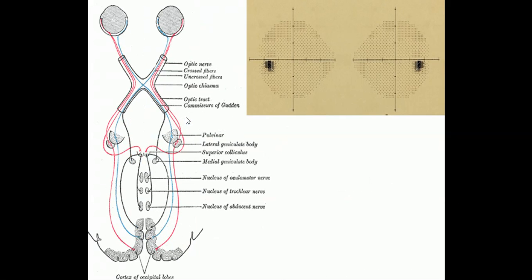Okay, so let's move on. So here's a visual field, and I hope that perhaps you recognize that this is a normal visual field. In the case of looking at our visual field by convention, and again we're kind of stuck with conventions here that sometimes make it a little more confusing, this side is now the left eye. So unfortunately, when we're thinking about an MRI slice, what we have on our left was the right eye. But when we're thinking about the visual field, what we have on the left is the left eye, and what we have on the right is the right eye. The reason is that whoever developed it chose to present the visual fields through the patient's perspective. So this, if you were the patient, is what you would be seeing.